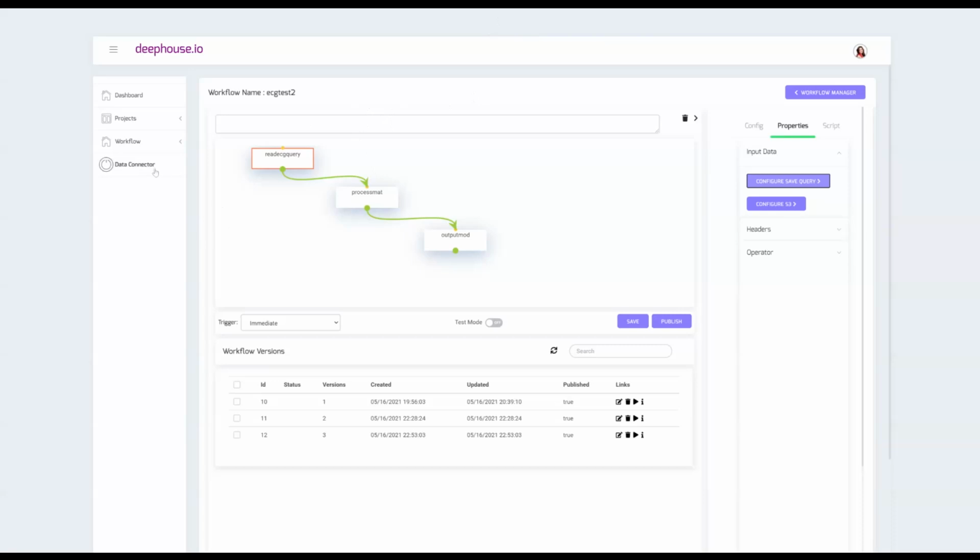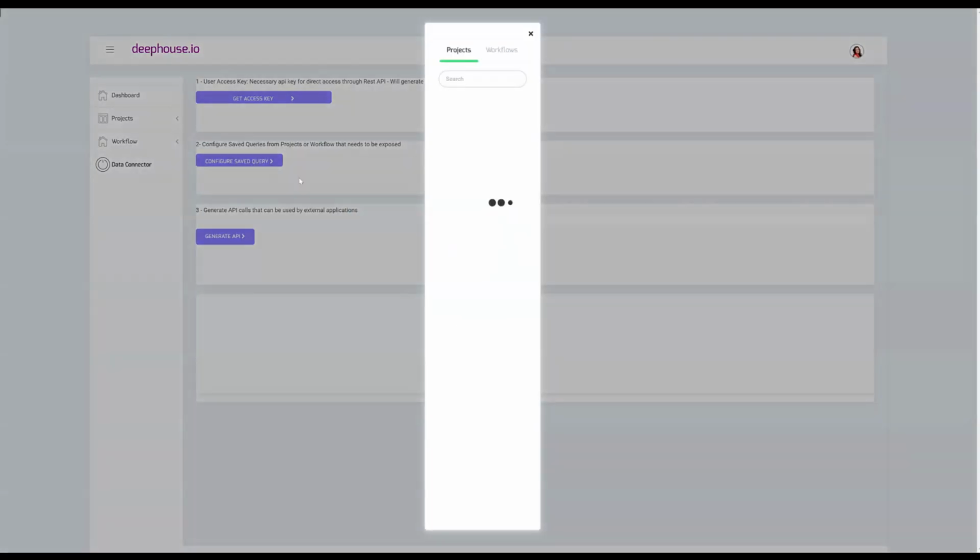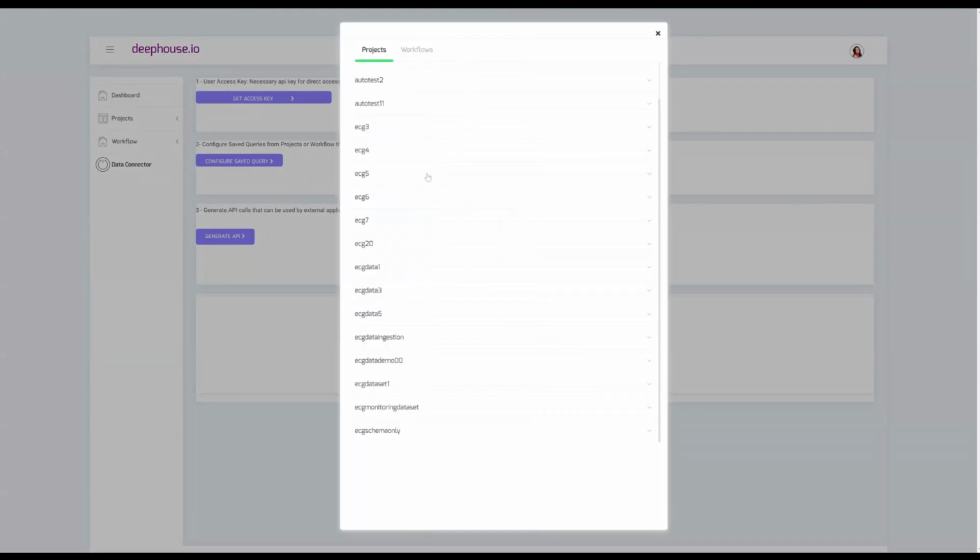One of the other features is, once we have this data set, I would like to visualize it. This is analytics as a service, or it could be a proof of concept engine, and you want to just visualize on a third party tool, or you have another website, for example, your client's website, and you want to embed it in their website. So for that, we're providing REST API calls to the dataset, and that again can be done through the workflow or the projects by selecting those.